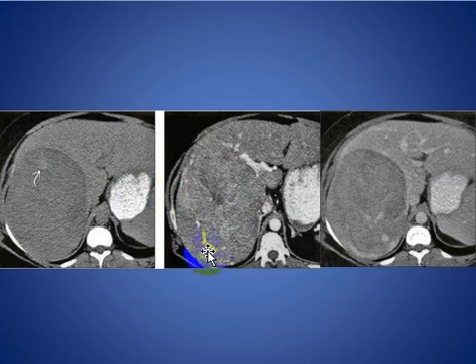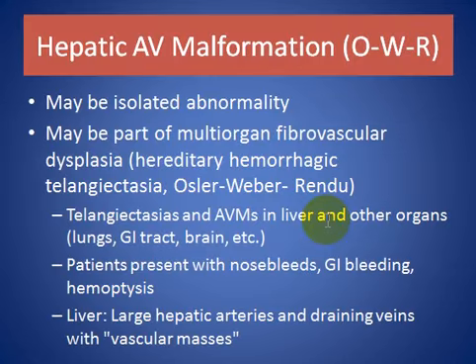In the arterial phase, this mass lesion is enhancing heterogeneously. On the delayed phase, there is washout, with some areas still enhancing, probably due to hemorrhage, in this patient with hepatic adenoma.